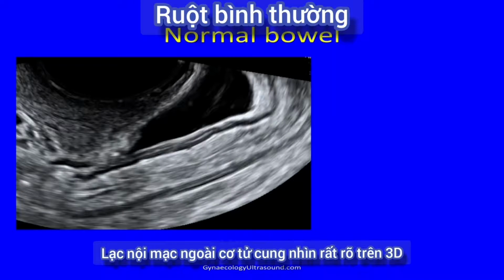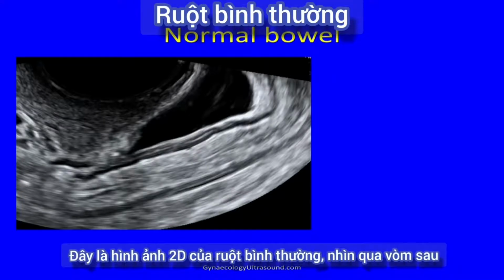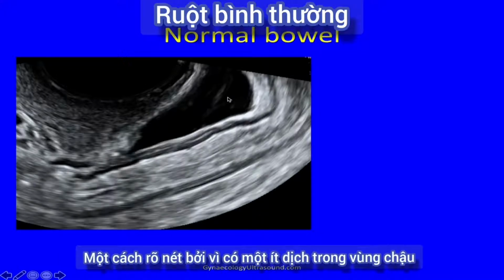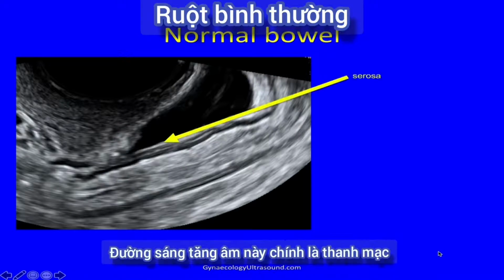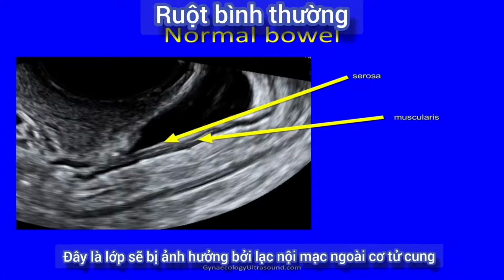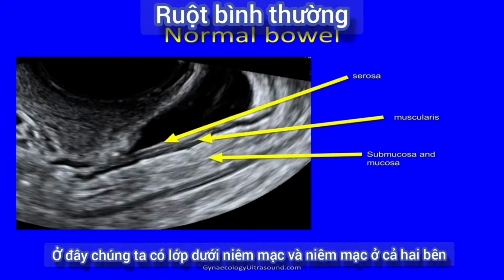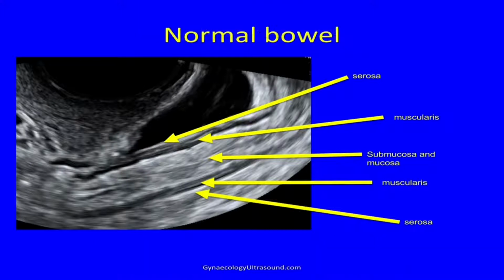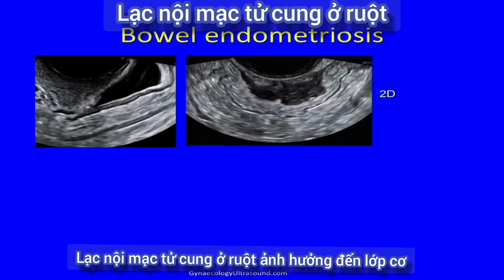Endometriosis is very nice to see on 3D. This is a 2D image of normal bowel. We're looking through the posterior fornix, and here you can see all the different bowel layers. You see it clearly because there's a little bit of fluid in the pelvis just there. And this hyperechoic line is the serosa. The hypoechoic line with a little bit of hyperechoic there is the muscularis, and this is the layer that's affected by endometriosis. Here we've got submucosa and mucosa on both sides, then the muscularis again, and serosa on the distal side.